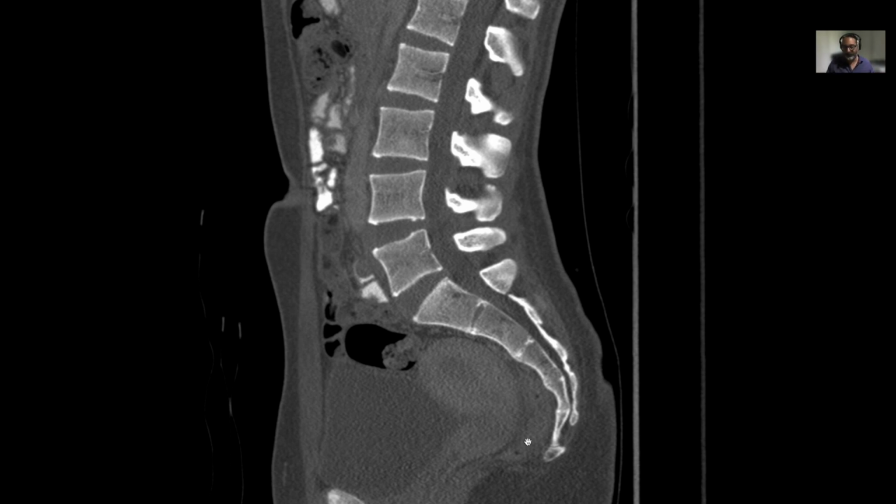So that's the sacrum. The sacrum curves the other way around and moves posteriorly, unlike the lumbar vertebra, and has a kyphotic curve as well. Now I think that is all from the sagittal perspective.